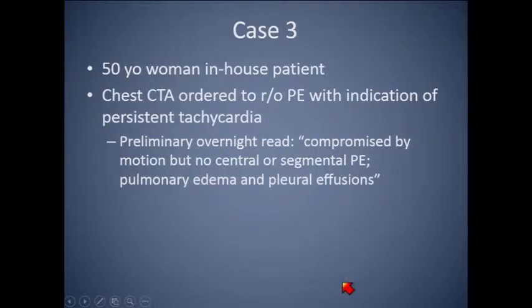Case 3. We do a lot of PE studies overnight on in-house patients, and I'm always badgering my residents to look at the heart, look at the heart, look at the heart. This was a lady, an in-house patient. She had a chest CT to rule out PE. We actually got an indication. A lot of times it just says rule out PE, but this one said persistent tachycardia.